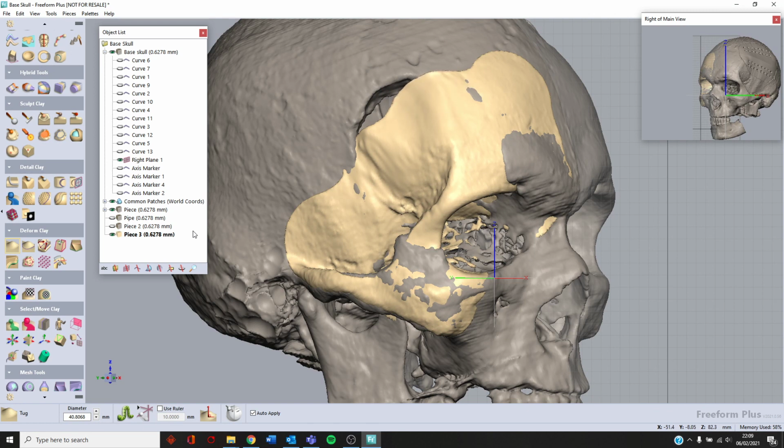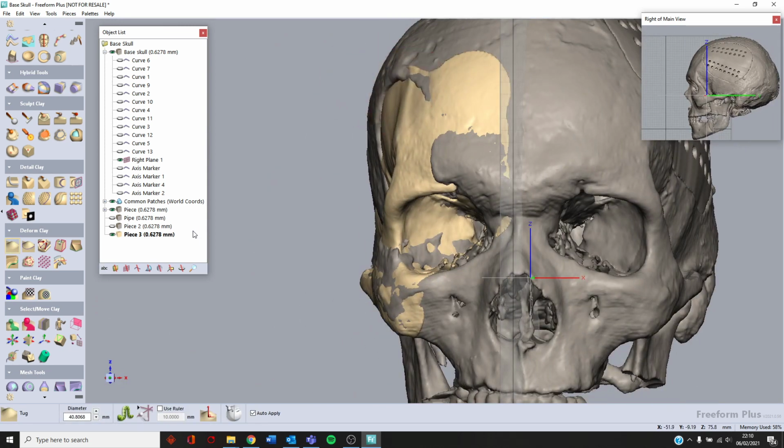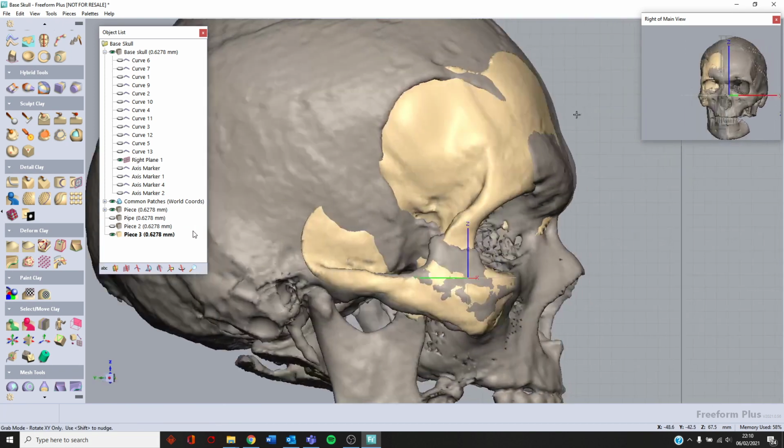There wasn't enough data to copy, so that's why I'll be stretching whatever I've got just to try to cover enough. Again, as you can see, this is something that you can spend quite a bit of time doing. Okay, getting it to the point where you're completely satisfied with your results.